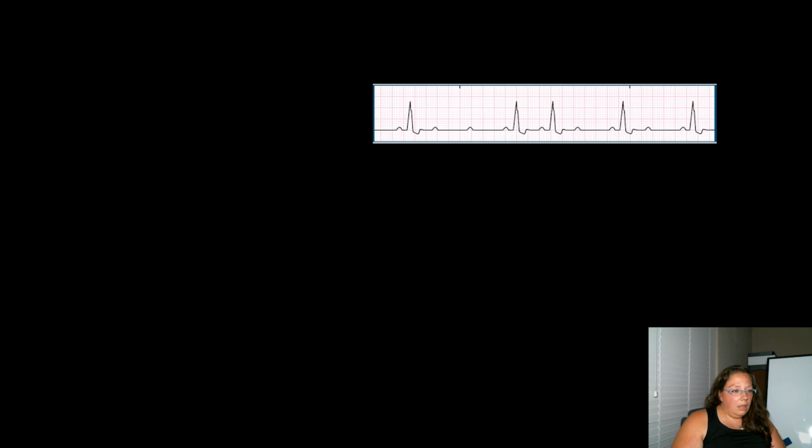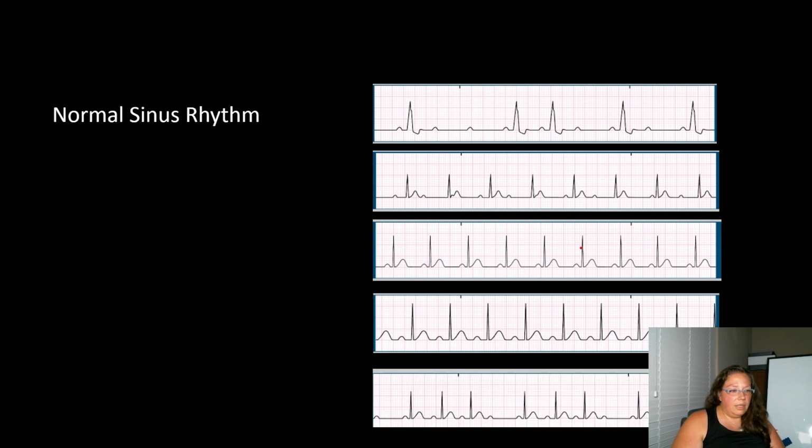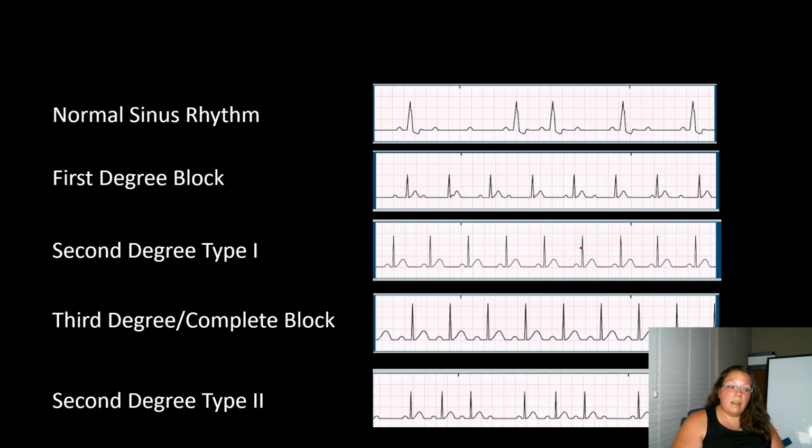All right. Let's go with questions. So this is a matching one. We're going to match the rhythms with what they are. Whoops. Okay. So here's this one.